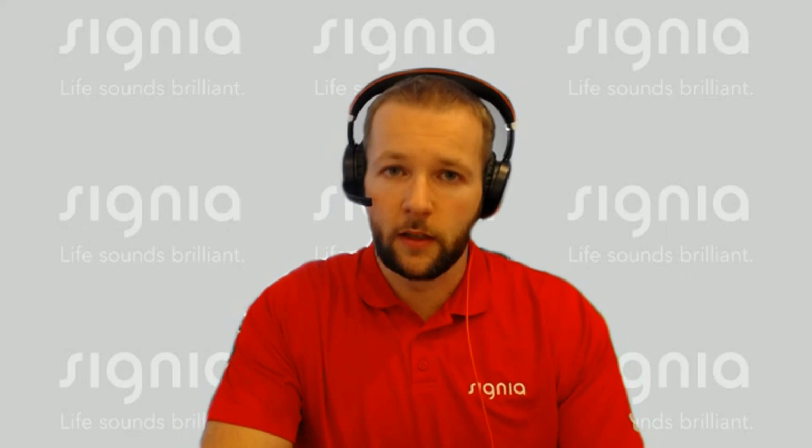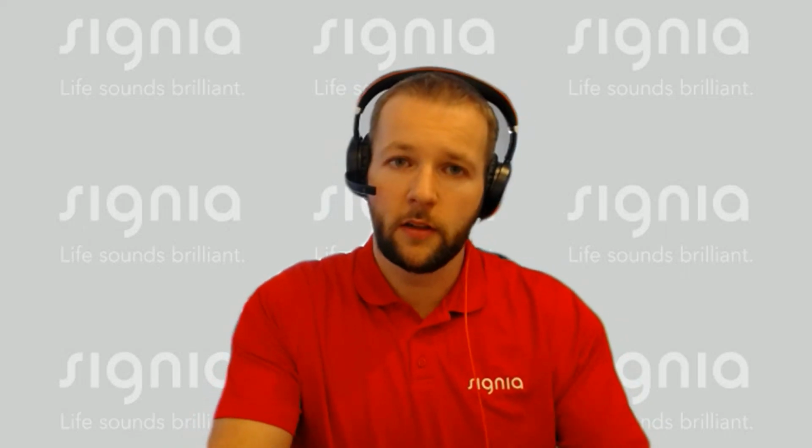So I will go ahead now and actually share my screen, and we can start from the starting point for where you will start once you have been registered with MySignia.